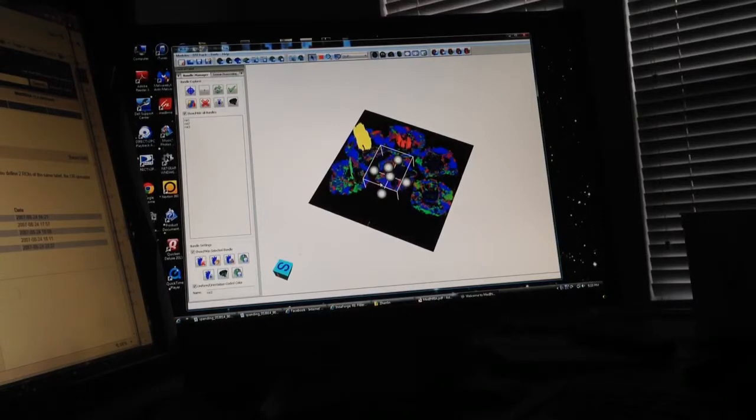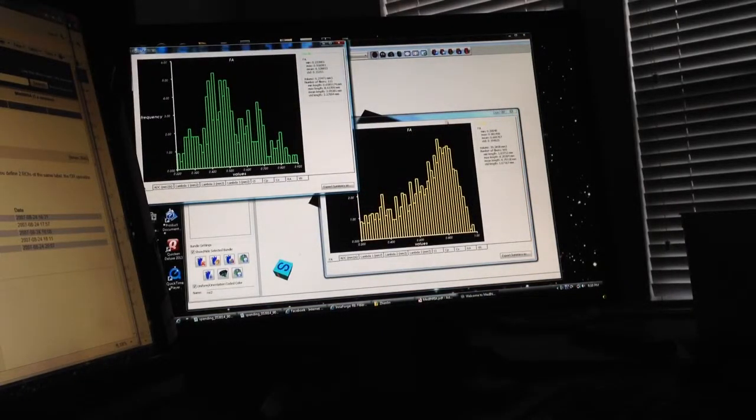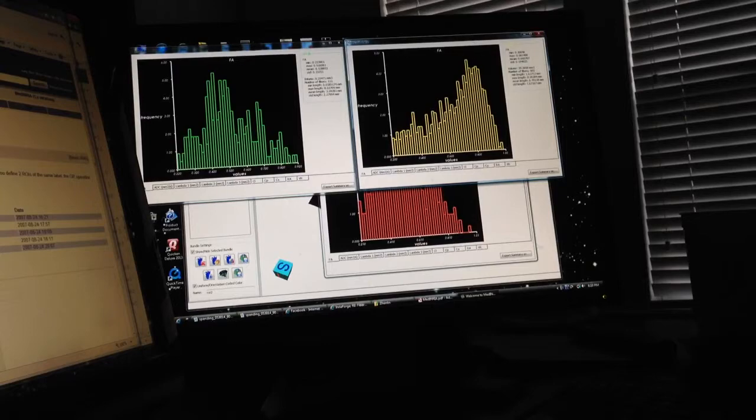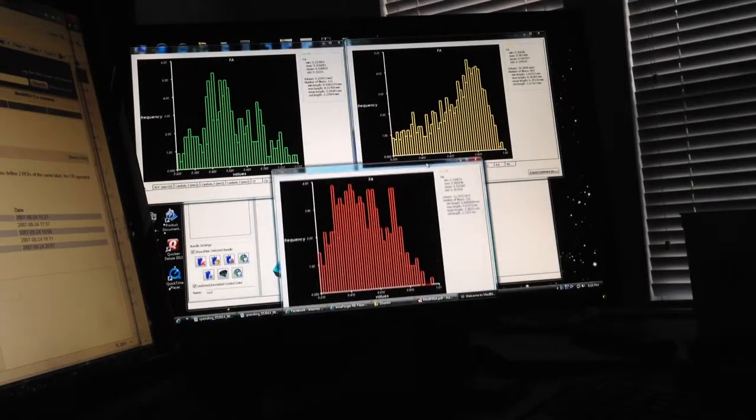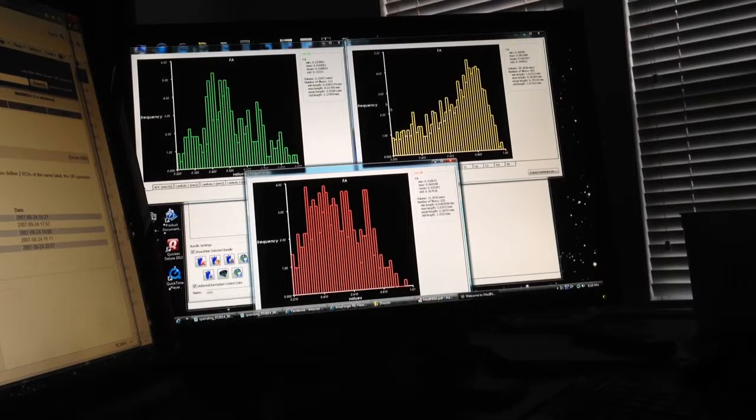And rather than go through all 6, I'll just now show you what you can do. You just click on this compute statistics of all fiber bundles. What this does is it gives you the statistics for each one of those ROIs. And what's beautiful about this is it's based on the entire ROI. And so you have your FA values. Of course, you can pick ADC or whatever you like for each one.